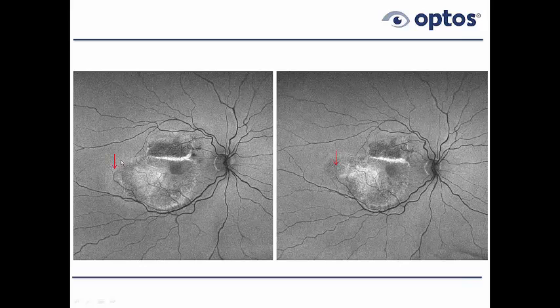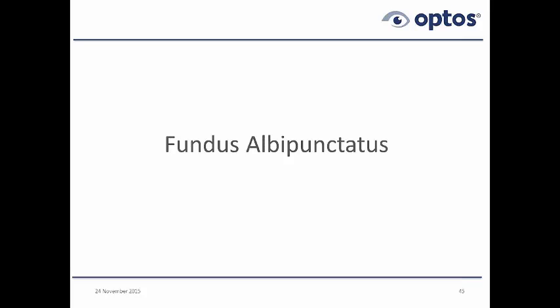For example, when we first saw this patient, over here on the left, we can compare the lesion to this vessel, and then about 3 to 4 weeks later, we can see that the vessel is here. The vessel didn't move, but the lesion actually expanded. So it's relatively simple to get a gestalt, look at these images, and tell if something is actually changing or not. And that's very, very useful. It may tell us that the patient needs additional anti-VEGF injections.